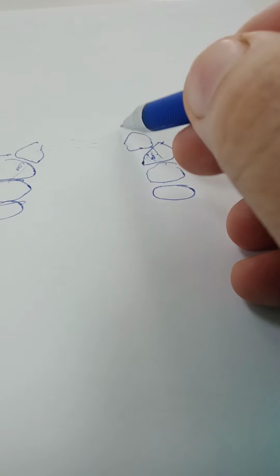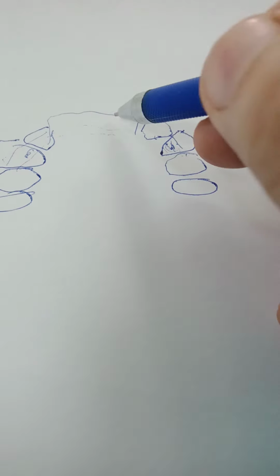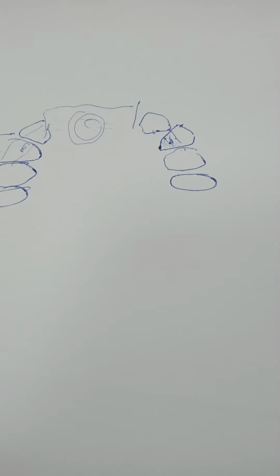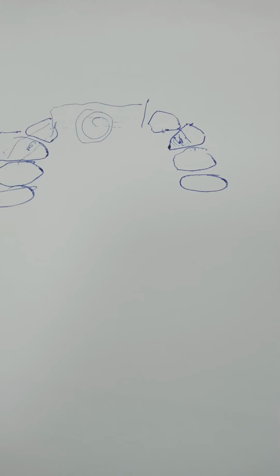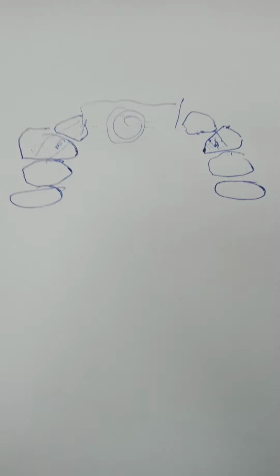But we have another way of indirect retention, which is the saddle itself. The saddle itself can work as an indirect retainer. Okay, so we didn't include that in the previous video. I needed to add that here because you asked about it. Do we need to place the cingulum rest or not? If we're going to use the saddle area as our support, we can avoid using the cingulum rest.